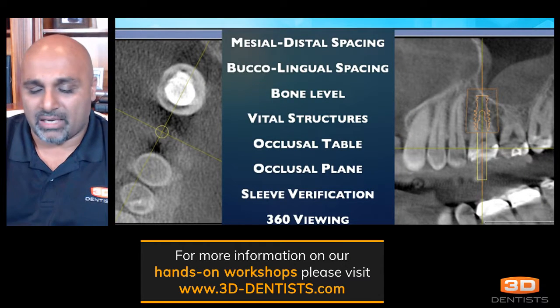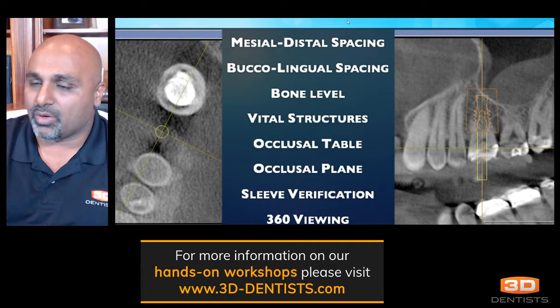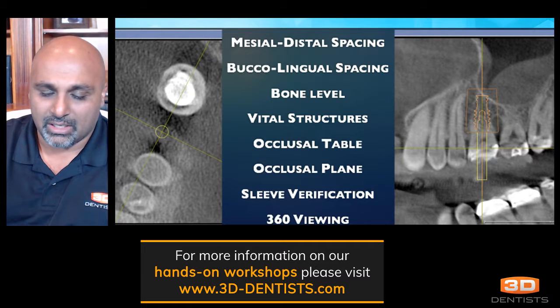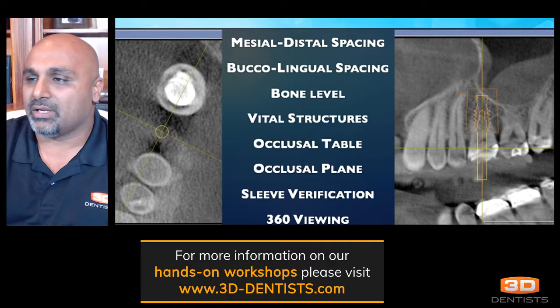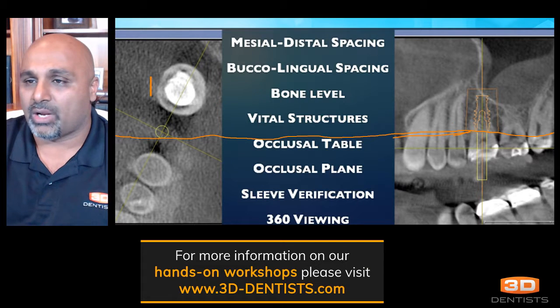So to kind of make this a little bit easier, one of the things that I've worked on is developing a way that I'm mentally planning my cases out. And what I'm looking at here is our implant planning worksheet that I use. And most of this is mental here. And what I'm looking at here, this is the bone.